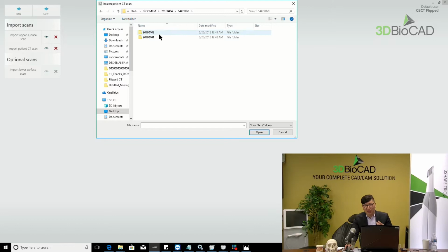And then now I have a two-way. So which one is the right one? Maybe the newest one or not, I'm not sure. So let me go to the bottom one first. Get in. Okay, I have another folder.